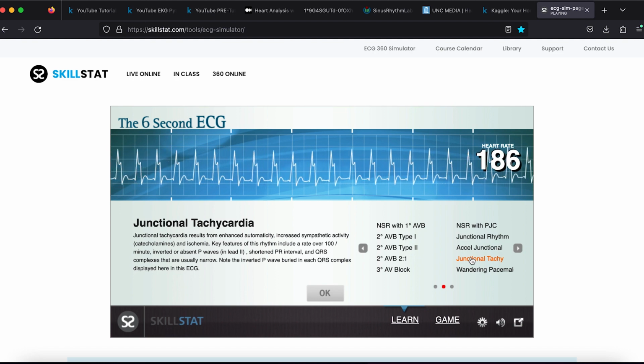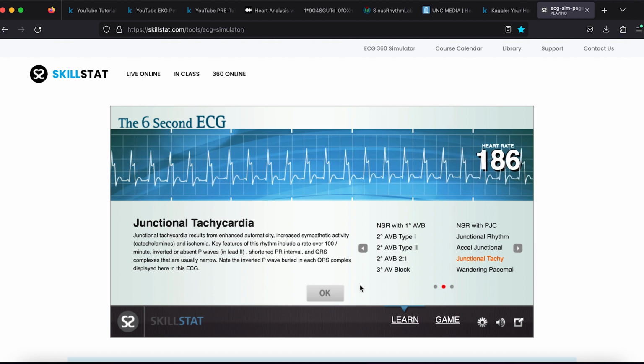So our code is pretty much going to characterize the waves by measurements. Unlike other tutorials, we're not going to talk about machine learning. We're not going to talk about convolutional neural networks. We're going to say, hey, this wave is here. It is this size and shape, and then it's followed by this wave, which is this size and shape, and that indicates possibly this type of heart disease. It's going to be very straightforward and rote.